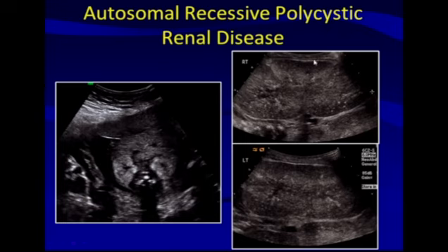But at birth in the NICU, we went up to scan this neonate who was having difficulty breathing, and here are these kidneys. These kidneys are massive. These were 12 centimeters each, the size of an adult kidney. On both sides, you can see this is what autosomal recessive polycystic kidney disease would look like at birth, and this neonate did not survive.